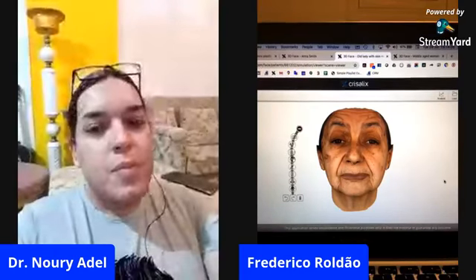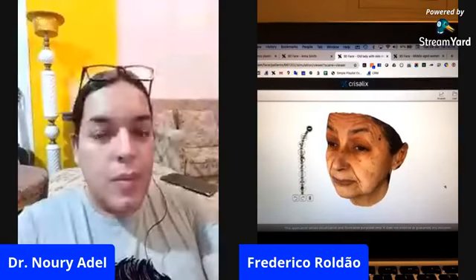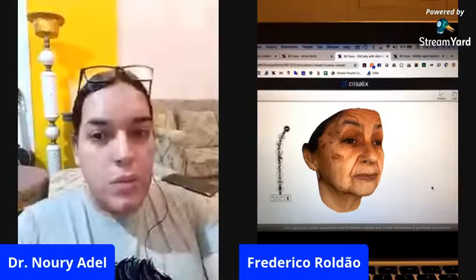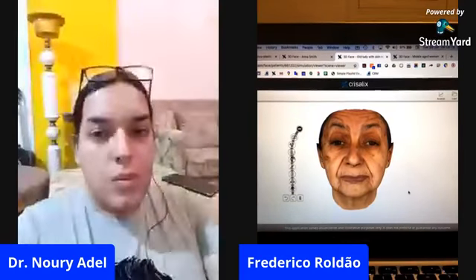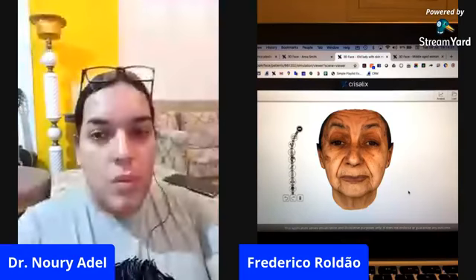So this is a 3D of a patient, and this 3D was created using that three-photo system with artificial intelligence and deep learning. And this 3D can now be analyzed so that we decide what is suitable for this lady.